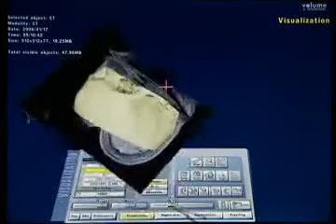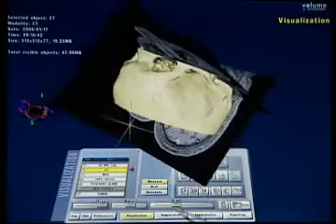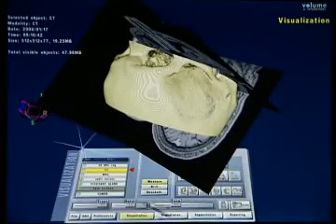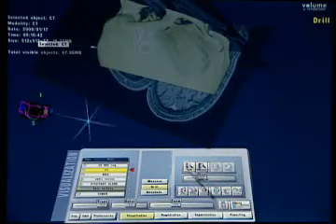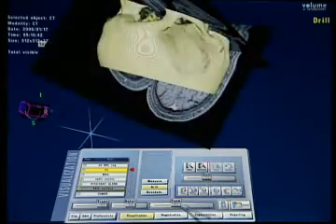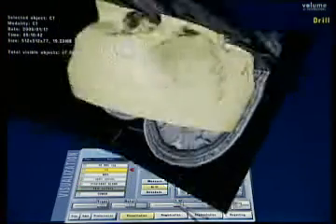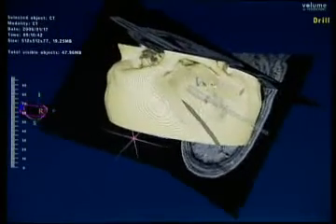So of course with this software you can try any approach and just see if it fits your requirements and if you can access the lesion. So let's try the supraorbital approach. I'm having the CT. I have a virtual drill. It's like a voxel editing tool. We are dealing with voxels, which is three-dimensional pixels. And that tool is editing them in real time.